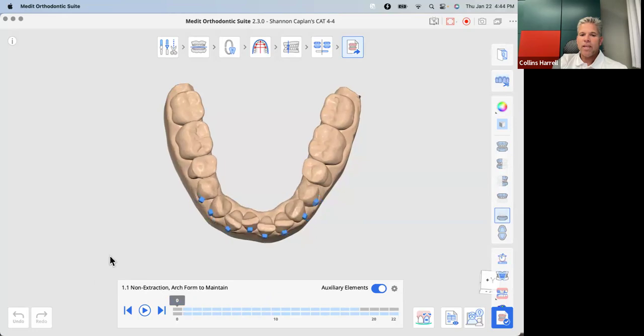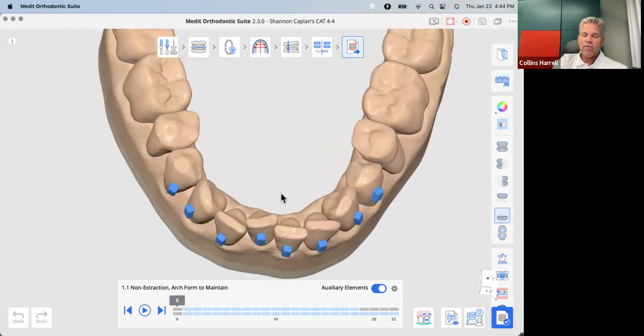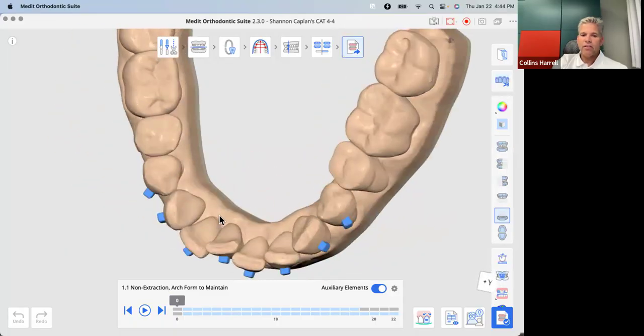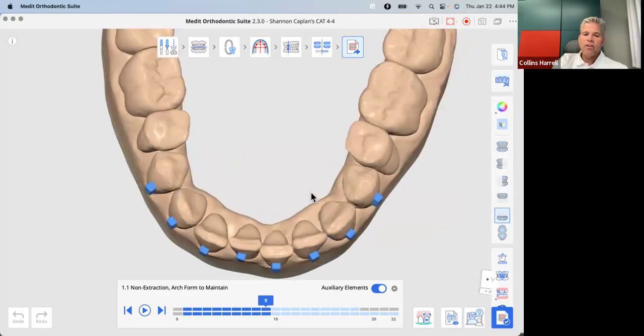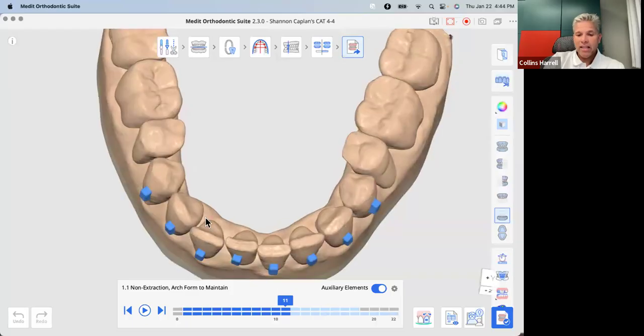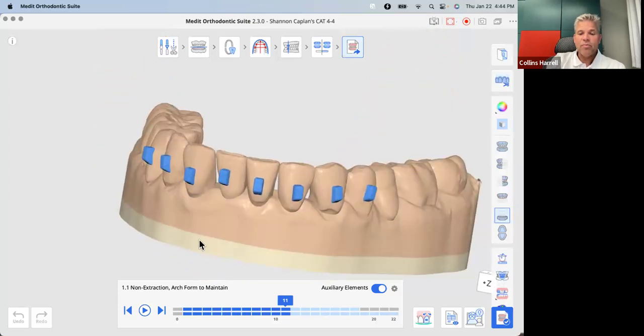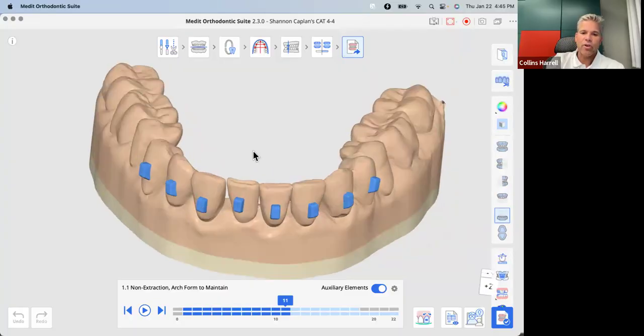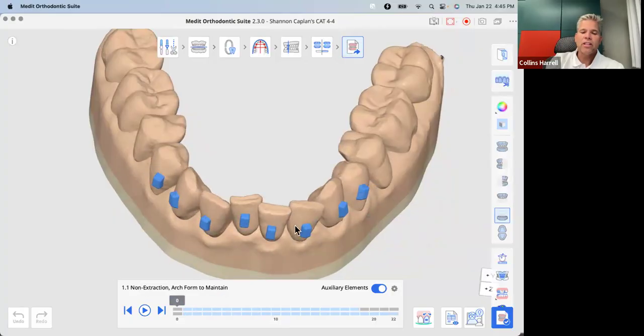And look at how much it opens up the case. Now, when you have all of this overlap between the teeth, there's a lot of the tooth that's not even visible to the scanner. And if you were to go 10 aligners, you actually now have opened up spaces, so that now the scanner can actually see all of the anatomy of the teeth. So if you go back in after 10 or 11 or 12 aligner stages and rescan your next set of aligners, because you're going to set up the case, your next set is actually going to be more efficient because it's going to be able to have the real anatomy of all of these interproximal spaces and embrasures that initially were all covered up.